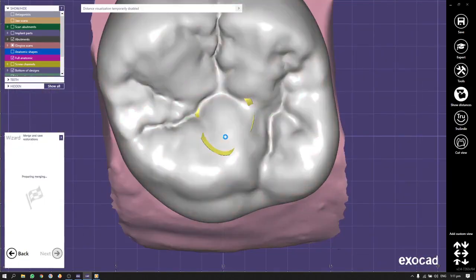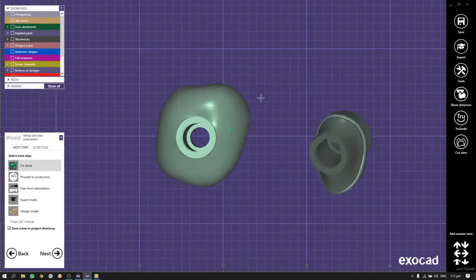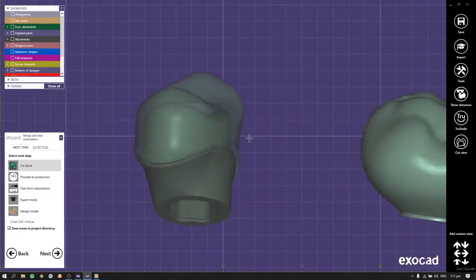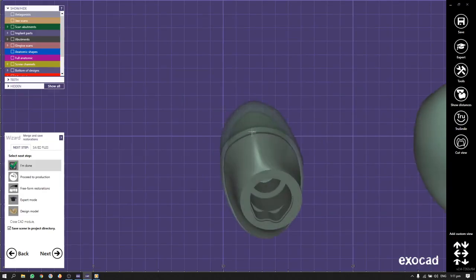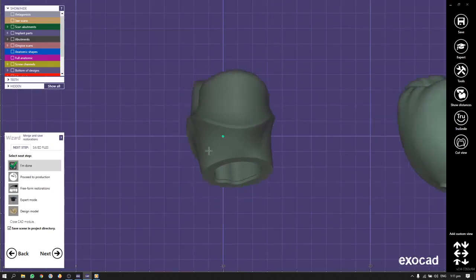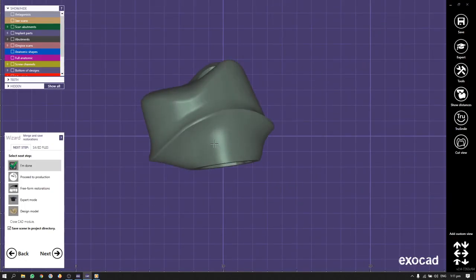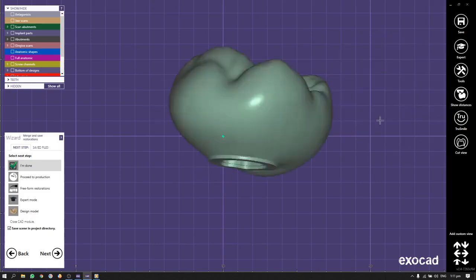We press next. So we are finishing the design of the full anatomy. You see a beautiful shaft, beautiful seating area, beautiful housing, and here is the abutment and a cap. To avoid any problems with the fixation of the secondary superstructure on the abutment with the immediate design, we can try to locate the abutment under the finish line and do this precise geometry during the design and milling, so we have a very nice precise fitting of the crown. So it's ready.